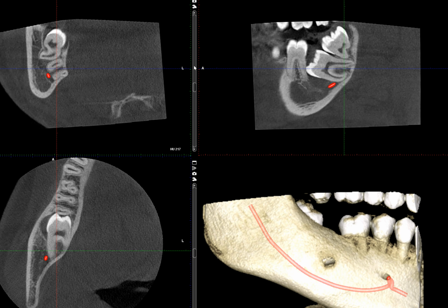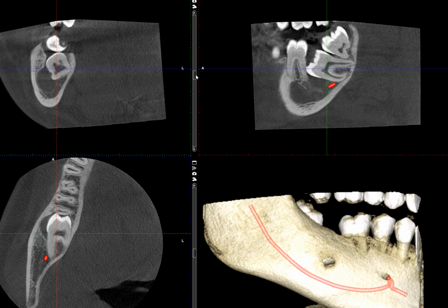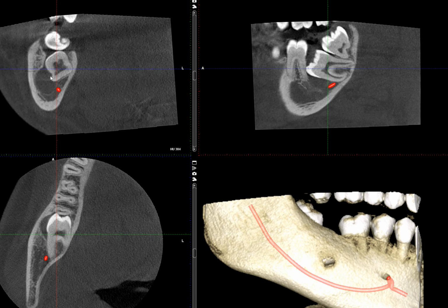And let's continue to pay attention to our coronal section as I move anteriorly. We saw that there was a lesion, at least from the panoramic radiograph, that's below the crown. But the new information we have here is that the lesion appears to extend buccally as well, and has caused rather significant thinning of the buccal cortical plate. Furthermore, I want you to see that this lesion has caused some resorption of the root.